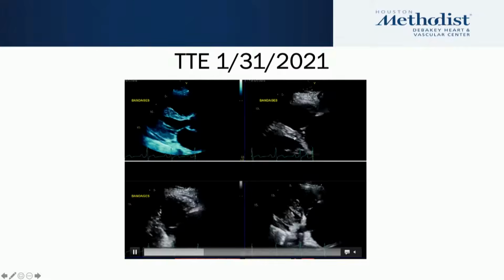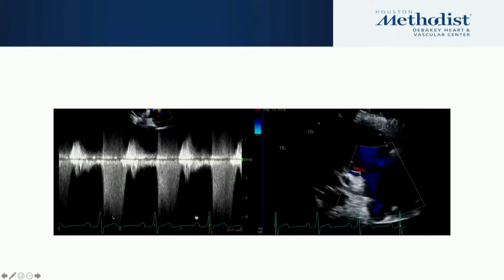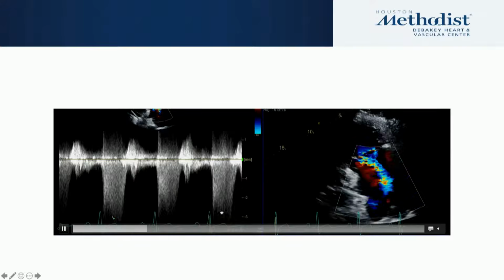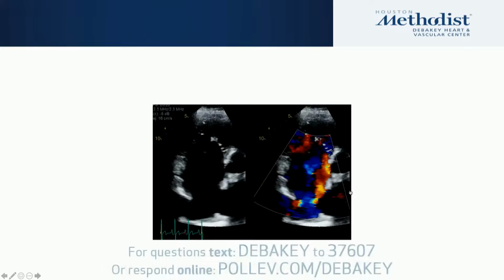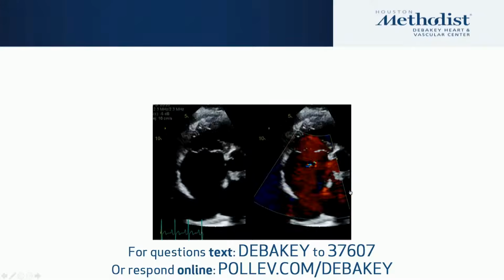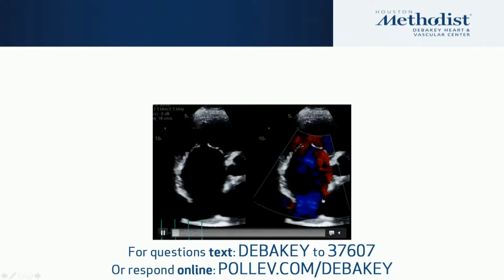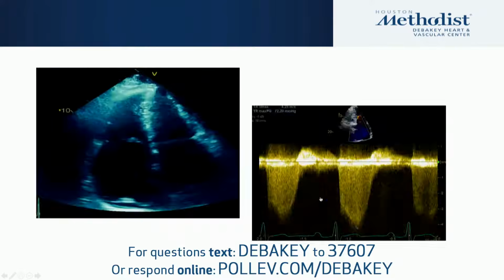The LA is big. This is your tricuspid valve, and you can see that the annulus is dilated. Also, you can see on this incomplete envelope for the TR that your RVSP is not fully estimated here, but it is at least 3 meters per second. And you can see there's moderate to severe TR from the color Doppler. This is the short axis view of the aortic valve, and we're now focusing on the right atrium and the interatrial septum. So you can see here the moderate to severe TR. I would argue that it's a severe TR at this point. And there is a small jet that you can see here, the color Doppler I meant, in the interatrial septum, which is consistent with what we know about the ASD.